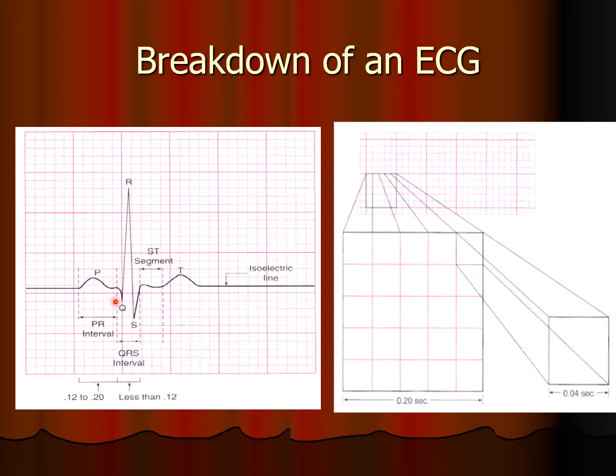Skinny. I joke when I do this class in person and talk about the Kardashians, we want a Kendall. We want a supermodel skinny QRS. We don't want any Kims over here. No junk in the trunk. We want a nice skinny QRS. That means nice healthy ventricles with no detours, no aberrant conduction, having to double back. When we have some of the heart blocks, you'll see what we're talking about.